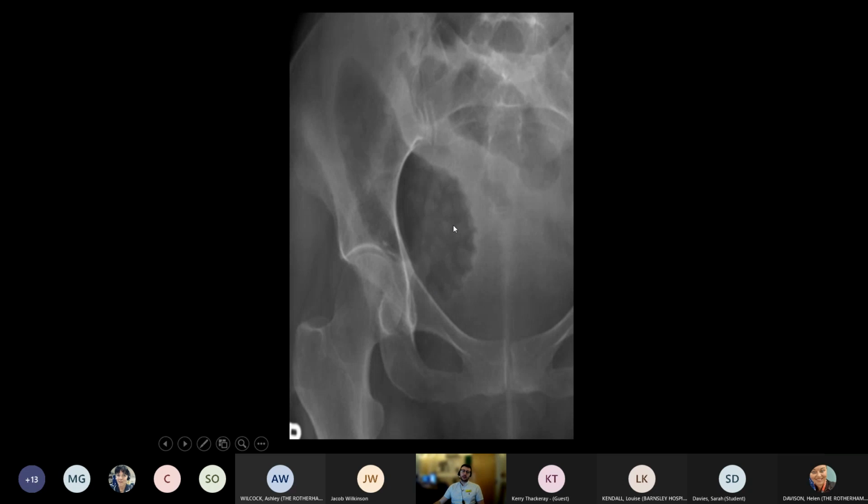Very occasionally you can see this ulceration, this pitting of the mucosa. Traditionally, you would see this more with contrast imaging, with fluoroscopy and barium enemas. But occasionally on X-ray, you can see defined areas of thickened bowel wall interspersed with the normal areas, and I dare say there'll be ulcerations to this bowel wall.